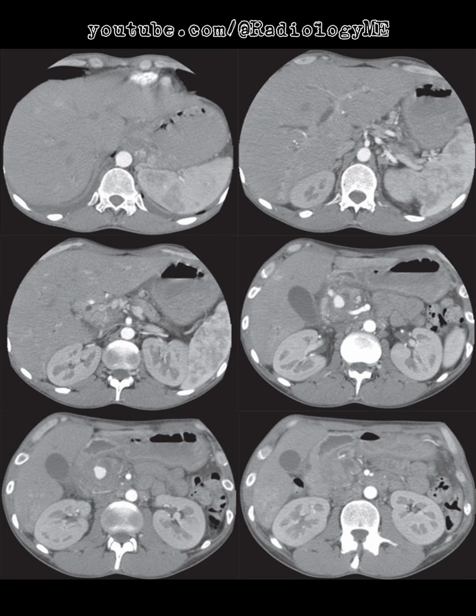We'd likely consider endovascular treatments, possibly embolization or stenting, depending on the angiographic findings. A catheter angiogram would offer more detailed anatomy, helping guide intervention. What makes this case particularly interesting, and perhaps a bit challenging, is the need to stay open to different causes of this enhancement pattern while not losing sight of the urgency. This is exactly the type of situation where collaboration across specialties is critical, and prompt communication with the referring clinician would be vital to ensure the appropriate action is taken swiftly.